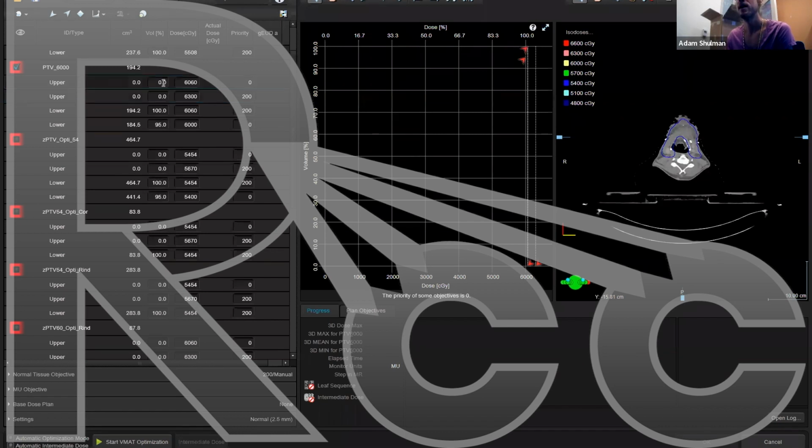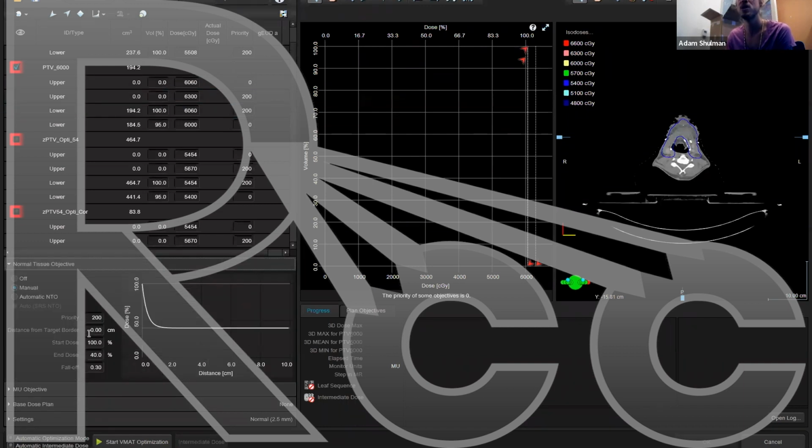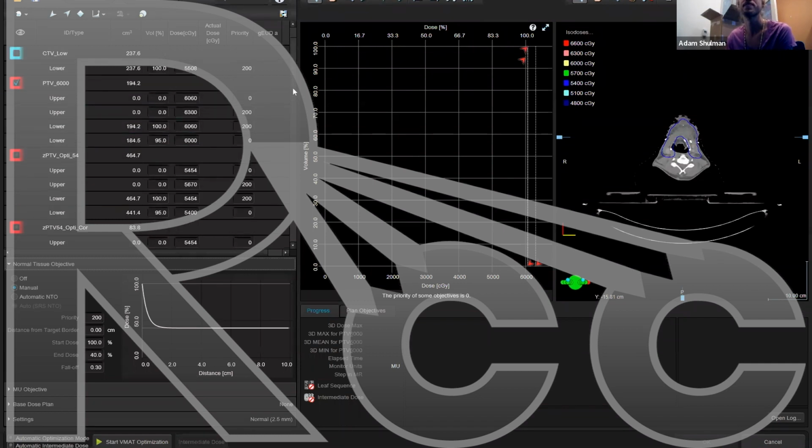And then this is for Eclipse users only. This fake upper objective, which is the same as the lower objective, is for Eclipse only, just because with our normal tissue objective, this start dose of 100%, that start dose is a percentage of your lowest upper objective. So these are upper objectives. This is my lowest upper objective. That's the same as my prescription. So start dose of 100% means start dose at my lower objective. That's all that means. That's for Eclipse users only.